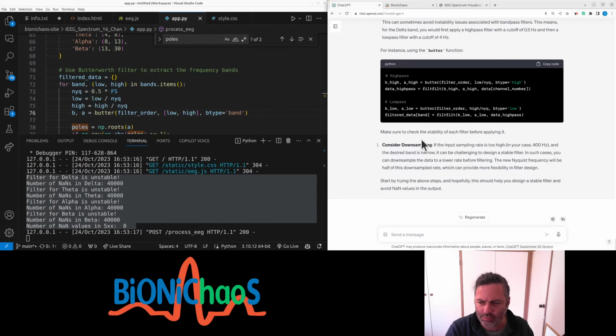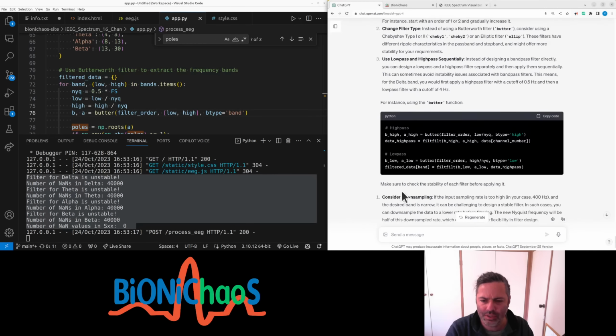Downsampling. 400 should be fairly low already. Don't know why the numbers go 1, 2, 3 and then 1 again.